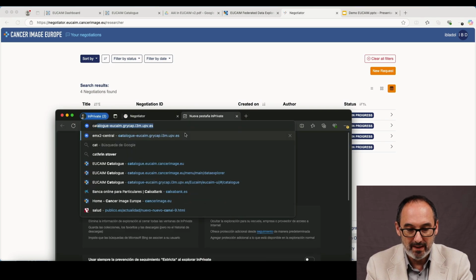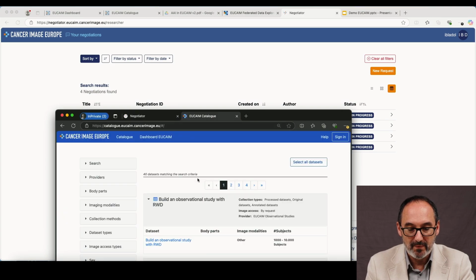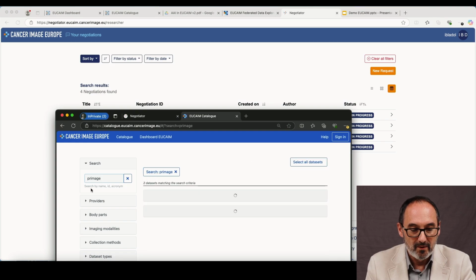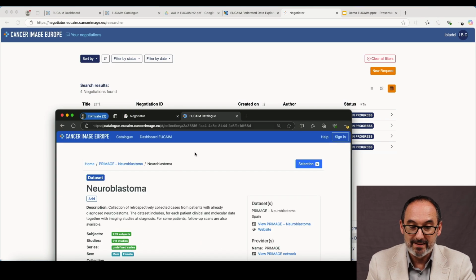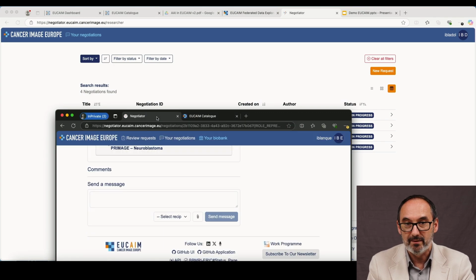And to facilitate the access, I will copy the access link to this dataset within a message. So I am the one managing the system, and I can search for the specific details. This is something that we have improved in our alpha version and will be released in the new cycle of the platform very soon.